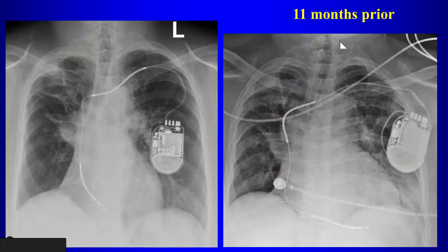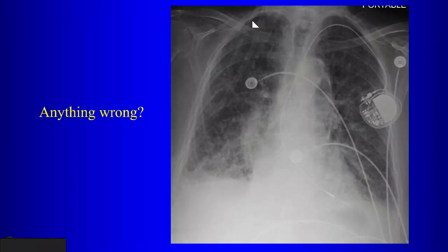And so this is why it's very important to compare with prior studies. This is 11 months prior, so you can see this is what it looked like when it was placed, and then now this thing is kind of coming out. Okay, so you do want to notice those kinds of issues with these cardiac devices.